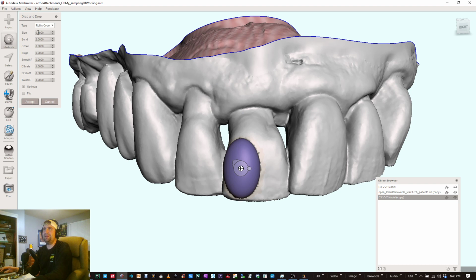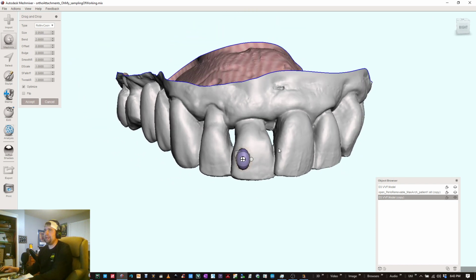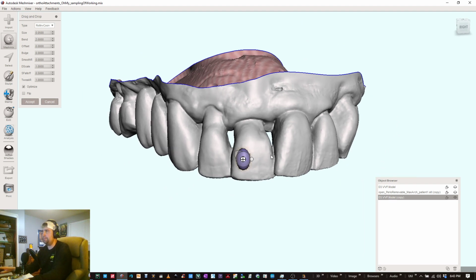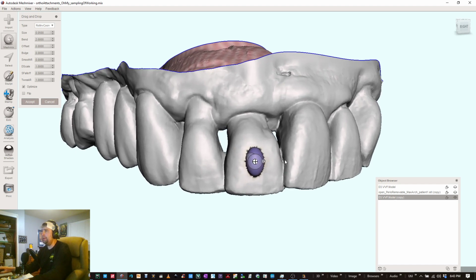that still looks really big. If it truly is a 3 by 2 by 1, so then I go to maybe 0.075. Maybe a little, I don't know, it still looks really big. 0.05. It's the most likely so far. I'm still not even 100% sure that's the exact dimensions there of 3 by 2 by 1, but that looks approximate.